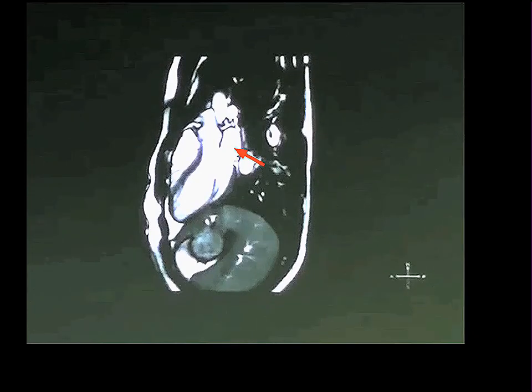Here is going to be, I think, left atrium, left ventricle. There's the aortic valve, very clearly, and the ascending aorta. If this is left atrium, here's a vessel which is running across the roof of the left atrium. Anybody remember the vessel which runs transversely across the roof of the left atrium? Well, you will on Tuesday. That is the right pulmonary artery.